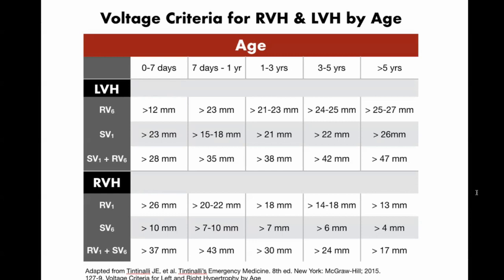It is almost close to impossible to remember all the values that are noted here. Therefore, know that they exist so that you can refer back to them when you need to diagnose left ventricular or right ventricular hypertrophy on a pediatric ECG.